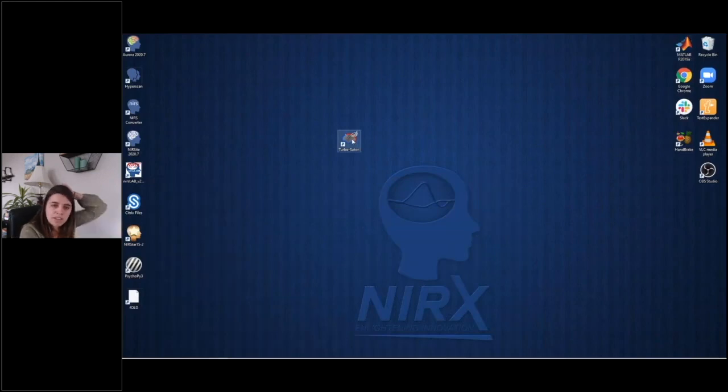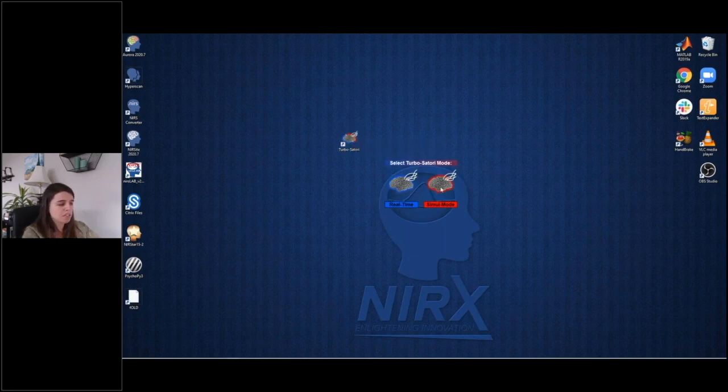So I'm clicking on the application here. I'm going to be prompted for either real-time mode or Simul mode. So starting out, I'm going to show you Simul mode to give you a lay of the land, and then we'll see data collection with Eric in real time. So this is loading up.